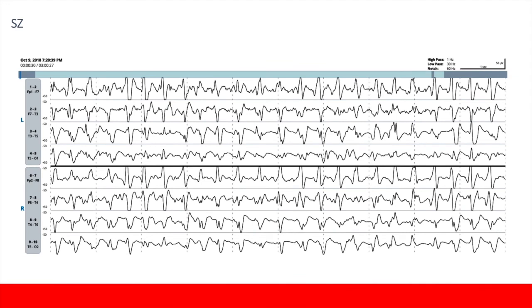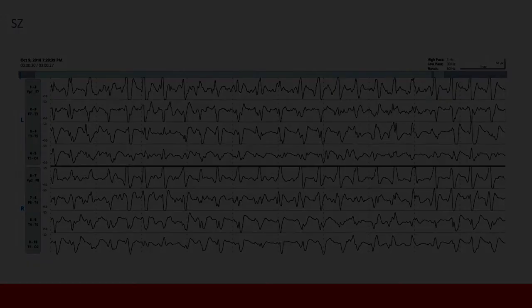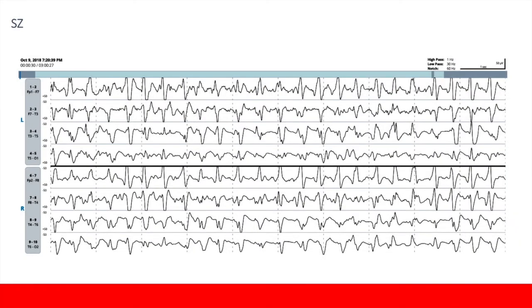In this particular patient, that evolving pattern in the preceding pages has gone into generalized rhythmic and continuous epileptiform discharges, which is the hallmark of non-convulsive status epilepticus, because I'm not seeing any myogenic artifact. The patient is not having any bodily movement, any muscle tensing, any clonic activity, and this is the case of so-called subclinical seizures. Often patients are lying stuporous or comatose or altered, and yet their brain is seizing away.